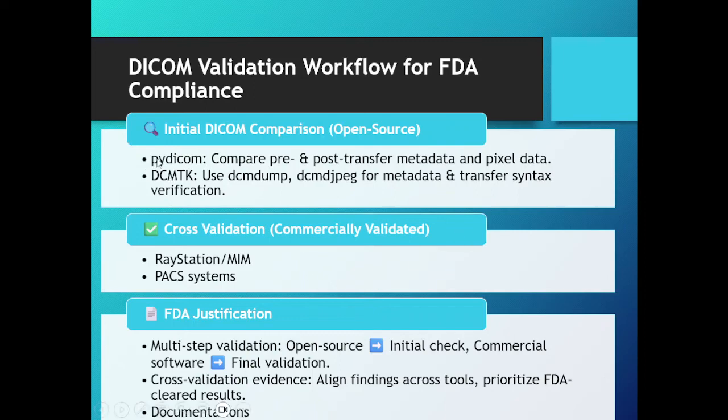But PyDICOM has its merit because we can batch process all the files, and we can easily output them to a report. So we can look at all the tags and different file types very quickly. But this is the initial DICOM comparison.